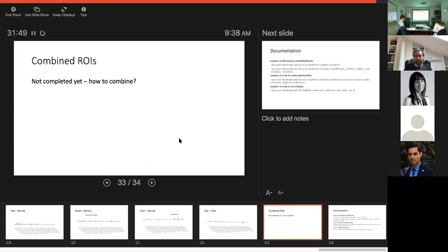Another way to reduce the number of ROIs in a more data-driven manner is to first look at which results show any activation in speech minus baseline, for example, in any of the conditions. If some regions are not showing activation in any of those conditions, you can remove those and focus on the regions that are speech-related, meaning they show activation that is differentiable in any of the speech conditions versus baseline. Then we look at the difference between the several conditions in an unbiased manner, because the way to discriminate the regions we care about is orthogonal to the second. So we could reduce the number of regions by first performing a simple speech minus baseline contrast and removing all of the regions that don't show anything there.